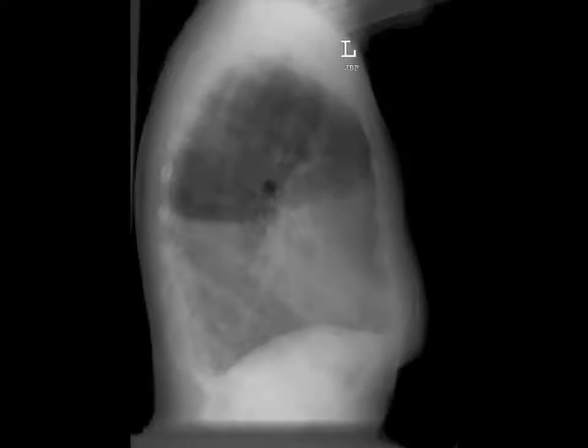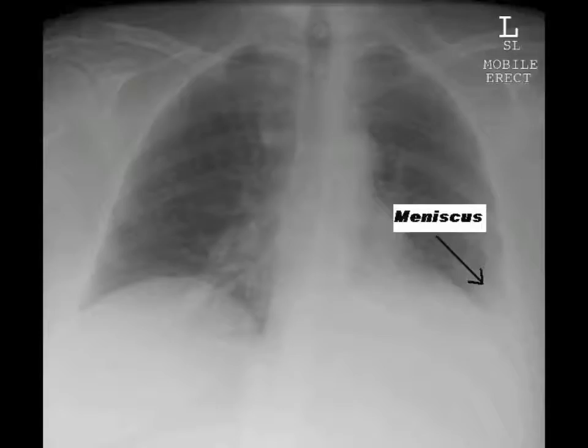Fluid in the pleural space is usually free to flow within the chest cavity under the influence of gravity and conforms to the shape of the cavity it occupies. In an erect patient, the pleural effusion collects at the base. The diaphragm margin is lost and there is uniform whiteness in the lower zone. In the absence of a coexistent pneumothorax, the fluid curls up at the margin of the chest wall due to surface tension, and this is known as a meniscus sign.